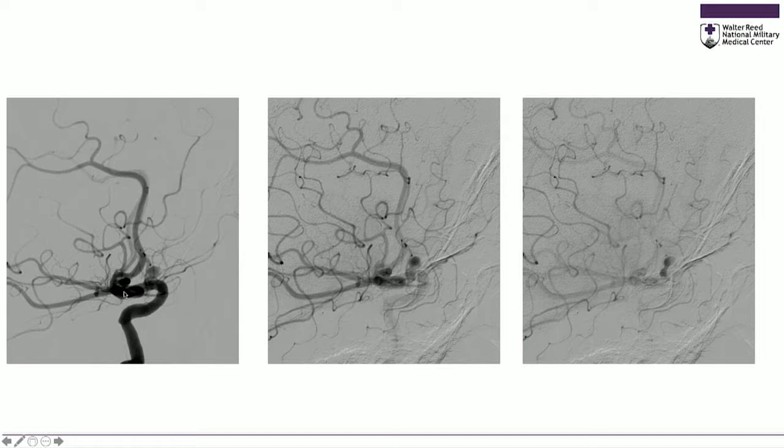Here is the internal carotid artery, the anterior cerebral, the middle cerebral. This is the artery going to your eye, the ophthalmic artery, and you notice right near it was a superiorly projecting para-ophthalmic aneurysm. Very difficult to clip surgically, a lot of bone in the way. So the surgeons put in a flow diverting stent, and you can almost see it right there. Yeah, I think that's projecting.